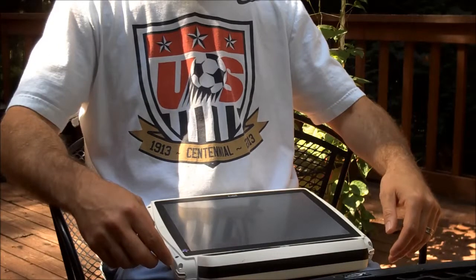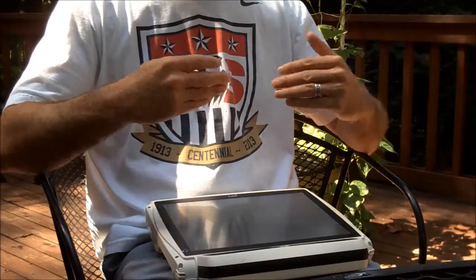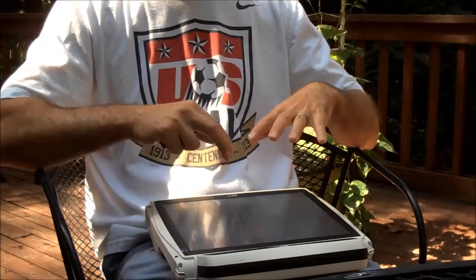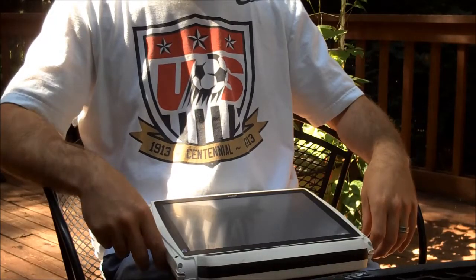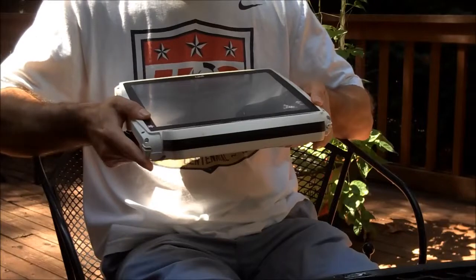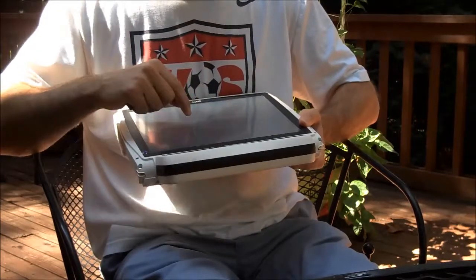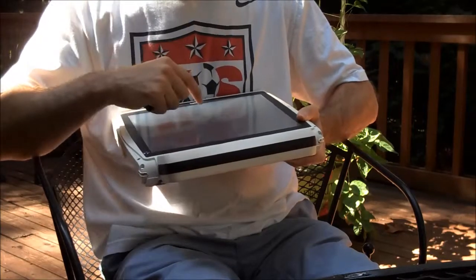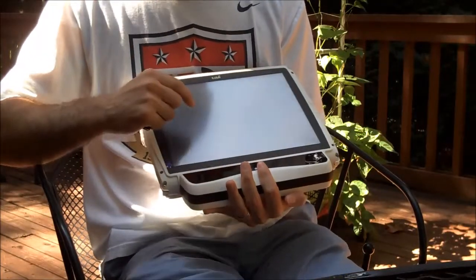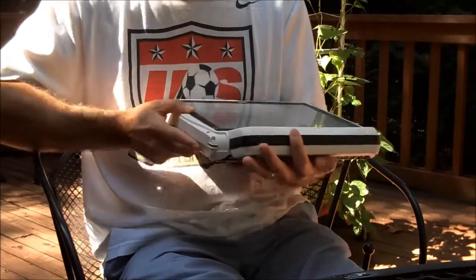And the way it is today, my programming background is going to come out, you think about the programming workflow. The process you go through to make a change, make an edit, or create a new page on Jay's device, and I think it's on most devices, there's essentially two workflows. The first workflow starts with taking the device away from the child, booting up the communication software in a design mode, going in and making changes on the device, flipping back into normal mode, making sure the page sets look right and work correctly, flipping back and forth between design and normal mode to make little tweaks until you're done, and then you can give the device back to the child, or the individual, to use.